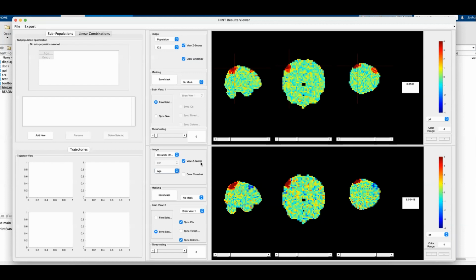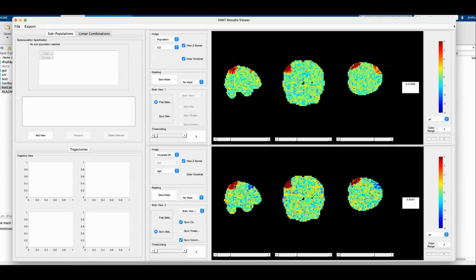So to demonstrate how we might do model-based hypothesis testing here, we've already converted these images to z-scores. This conversion is done using the variance estimator from the HCICA model. So regions in this map above a certain threshold correspond to what would survive hypothesis testing at that threshold.